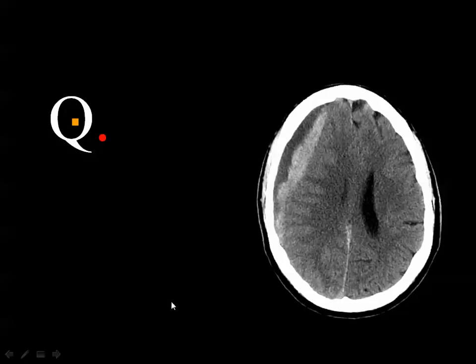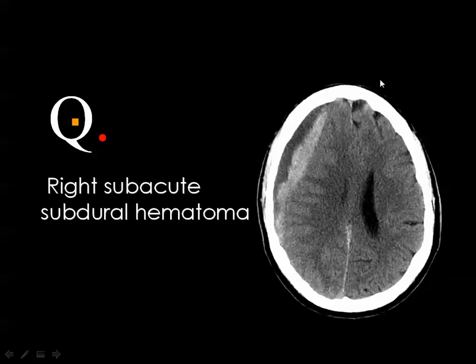Axial CT scan of the brain, soft tissue window without contrast, showing an extra-axial collection of mixed densities, hypo and hyperdensities, diagnostic of blood. At which stage? Subacute, because it contains both densities, the chronic and acute blood. And why is the sedimentation level like this? Because the patient is lying on his side. If the patient is lying on his back, the sedimentation level will be horizontal. But if he is lying on his side, then you get this appearance.